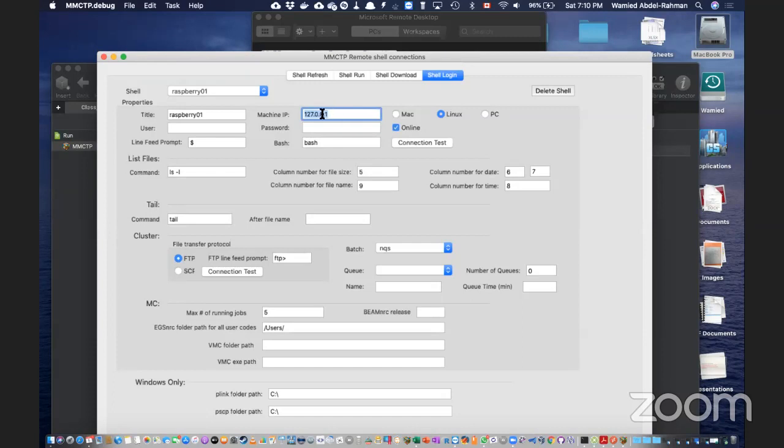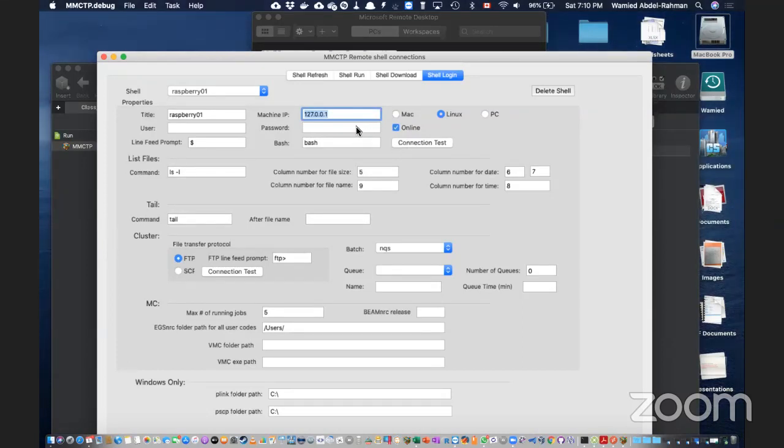So we have to deal with IPs. But what you can do is you can just type 127.0.0.1. This is always localhost. It points to your local machine, or localhost, okay? So in my case, my machine is dot 8.1, dot 11.